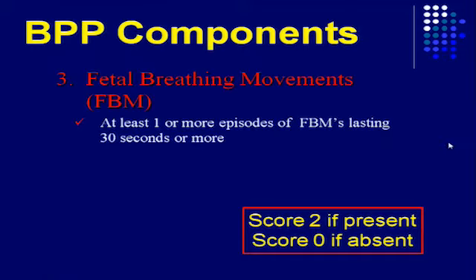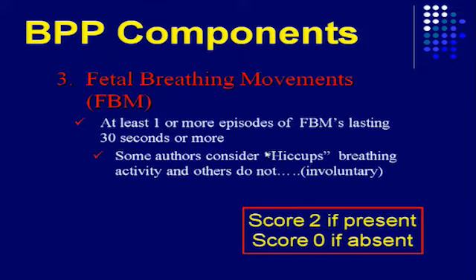Okay, and the fetal breathing movements. At least 1 or more episodes of fetal breathing lasting 30 seconds or more. That's the key. And you go, oh, I saw breathing. It has to be sustained for 30 seconds.